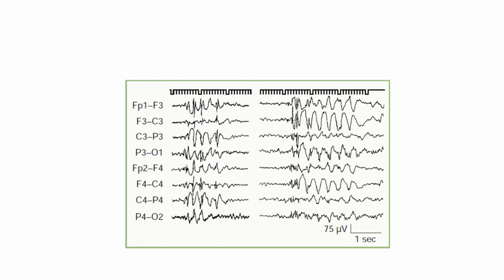2. Key electrographic features. Generalized synchrony. Notice how the high amplitude discharges burst into existence at almost the exact same millisecond across all channels. There is no focal onset or localized point of origin. Both hemispheres are recruited simultaneously.